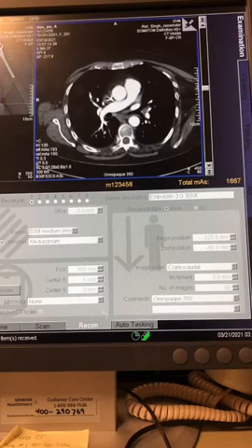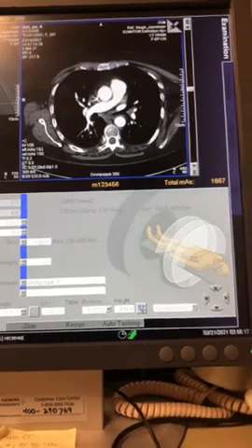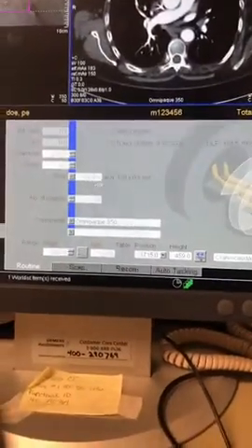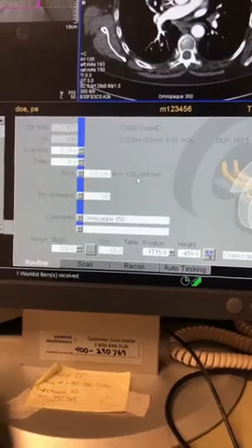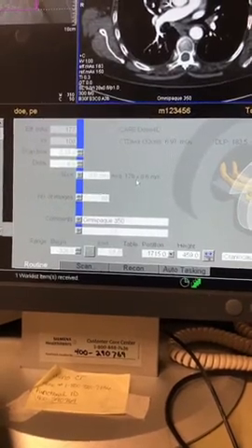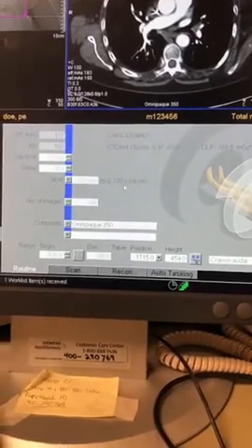All right, let's go through. We talked about that. These are 3 millimeters. Can you see that there? Yeah, 3 millimeters. Again, this acquisition is different. Now we're using 128 detectors. We're using the entire detector array at 0.6 millimeters. Okay, as small as we can get.